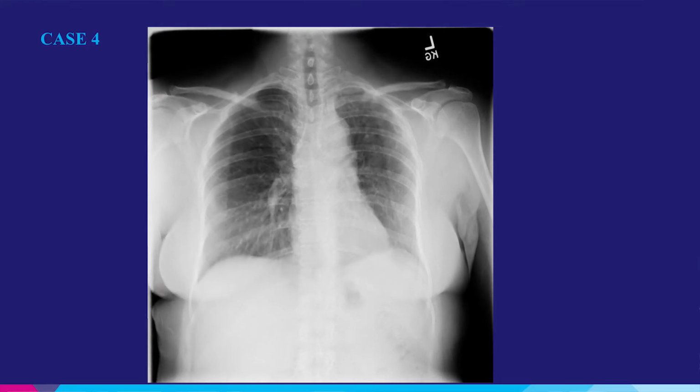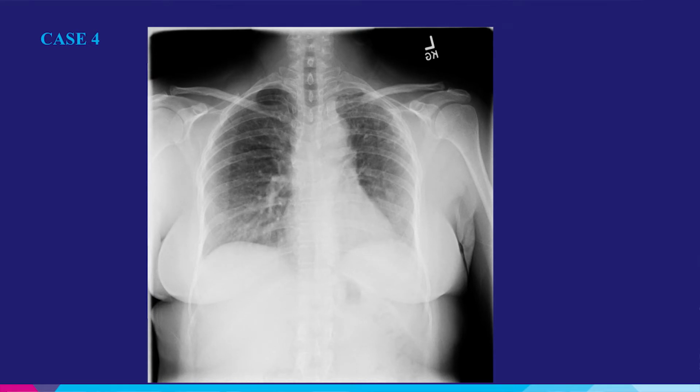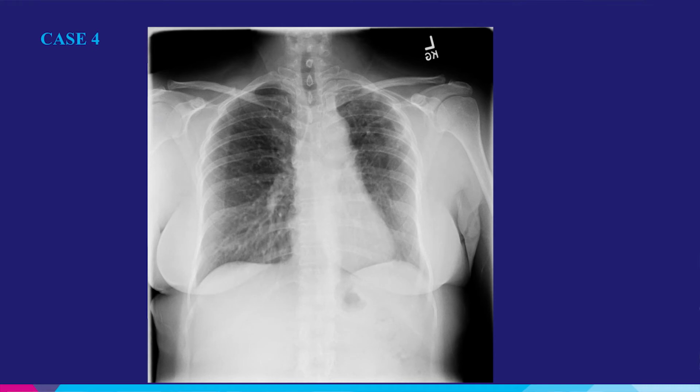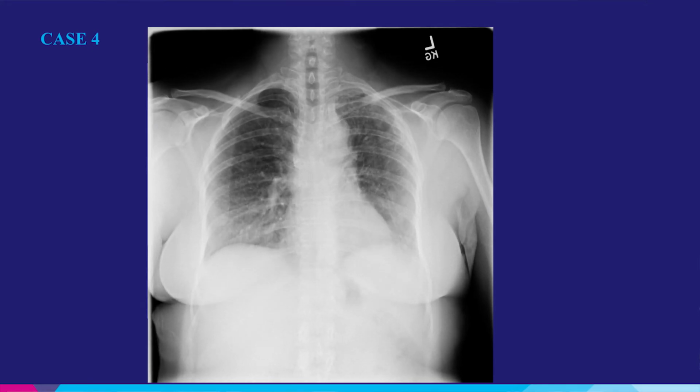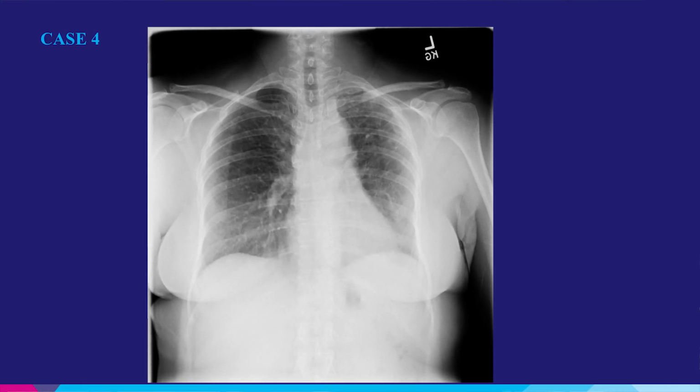She also has some asthma, but we suspect that this early eventration, that tenting and that scarring of that left hemidiaphragm and the pleura as well was causing some of her symptoms of shortness of breath, in addition to the left lung volume loss. So again, it points out the dynamic x-ray shows you that diaphragmatic paradox. This one is a little bit milder than the one that we saw in case number 2.